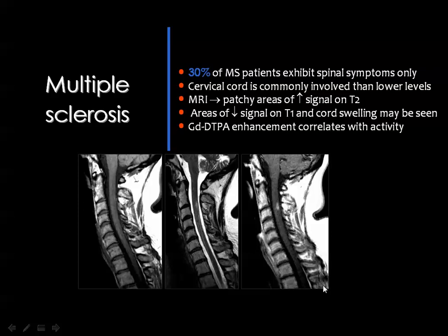The lesion will appear as a focal or, less commonly, diffuse area of signal abnormality. It usually cannot be appreciated in the T1, but it will be seen in the T2 weighted image as an area of high signal. Then if you inject contrast media and the lesion shows enhancement, this means that this lesion is active, exactly similar to the lesions in the brain.